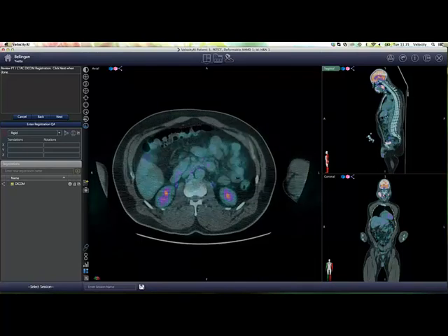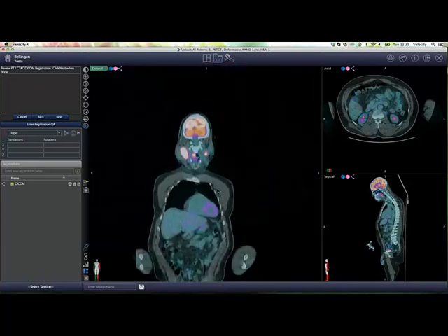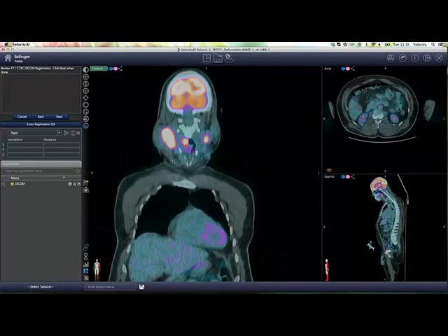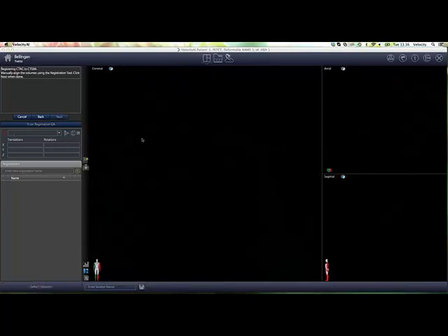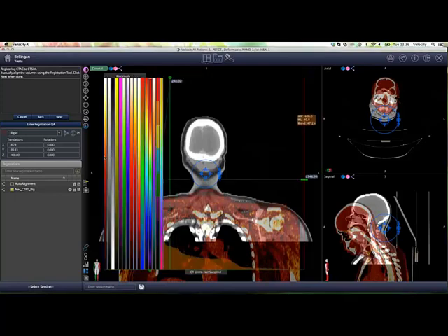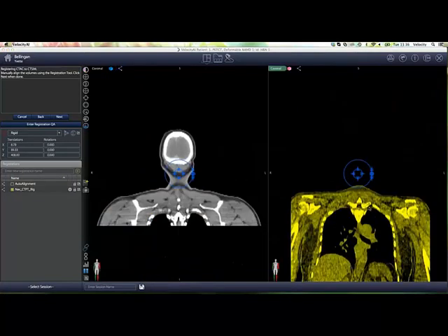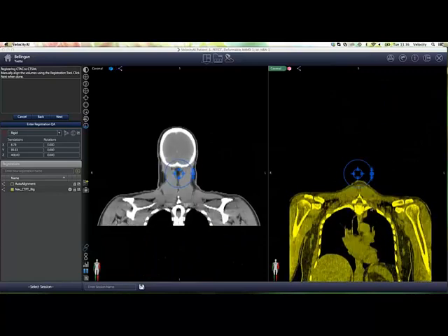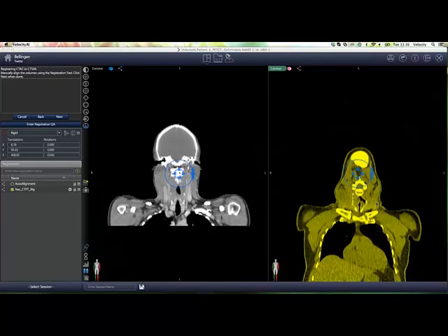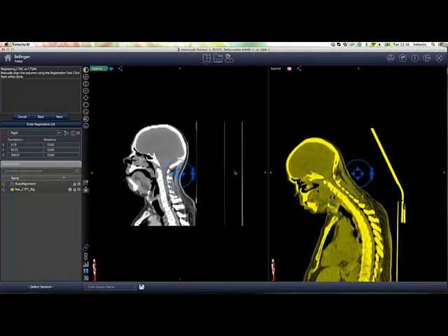So Velocity does 3 different steps. We normally do a manual alignment. After the manual alignment, we apply the rigid registration, and once that is done, we then apply the deformable registration. And you've got to check in all planes that you are well aligned, so you get it as best fit as possible. If you attended the AAPM presentations that John Pouliot and Mark Kessler did, you will see they also spoke about aligning your patients as well as possible, whether you're doing the rigid registration or the manual alignment, and then you let your deformable algorithm do all the rest.